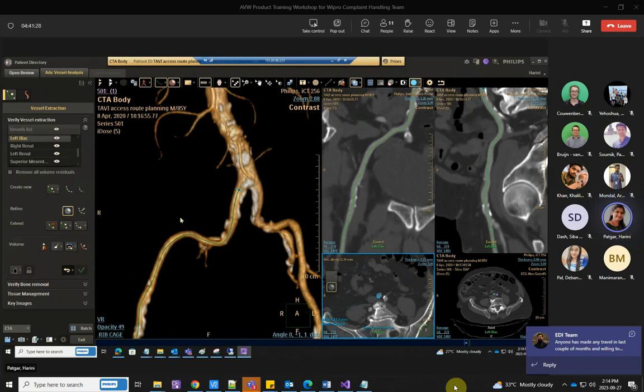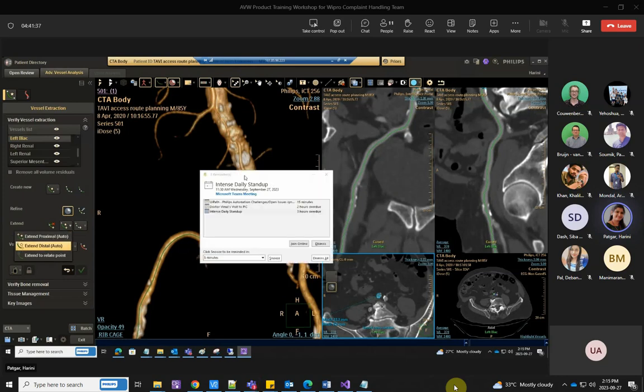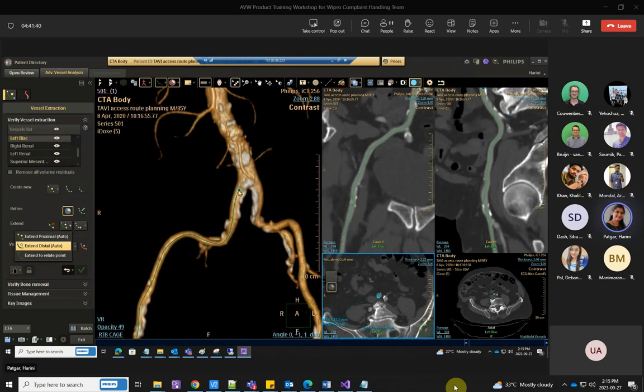So cut and extend is something like you will just cut from here and extend it another way, like the end point you will take. And this is extend proximal, extend distal, like either the top point of the vessel you want the center line to extend, you will place a point over here and say accept, it will extend to that particular point. So here you want till here, so in such cases the endpoint extensions we have separate tools.